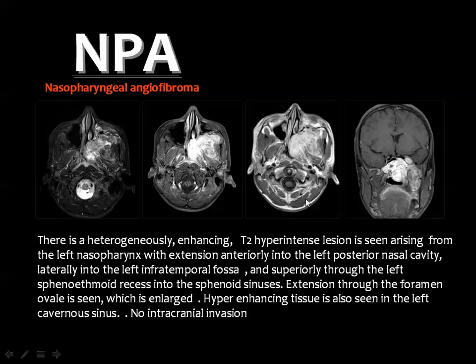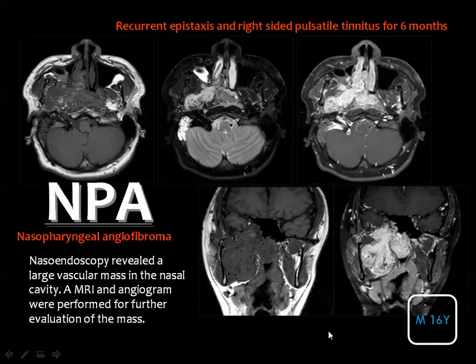You can appreciate clearly the extension of the tumor into the pterygopalatine fossa as well as the infratemporal fossa, and you can see the invasion or the extension into the sphenoid sinus.